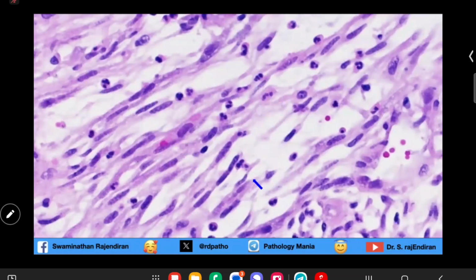And they may look like inflammatory myofibroblastic tumor, and some of them can be positive for ALK protein also. So these are myofibroblastic cells with extravasated RBCs and scattered inflammatory cells. Remember, inflammatory myofibroblastic tumor in the bladder, ask for history. When there is a history, it is not IMT, it is post-operative spindle cell nodule.